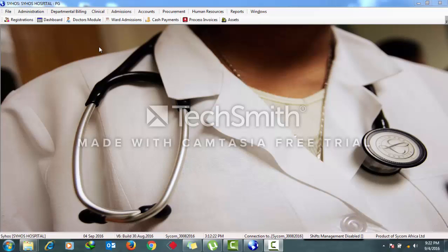Hi there, I want to take you through the Radiology Department or Radiology Module. I want to show you how to check on requests from the doctor, then how to post them, and then post the results back to the doctor.